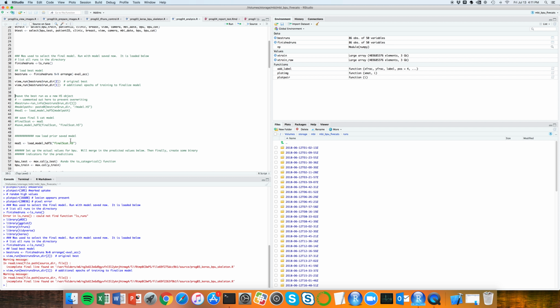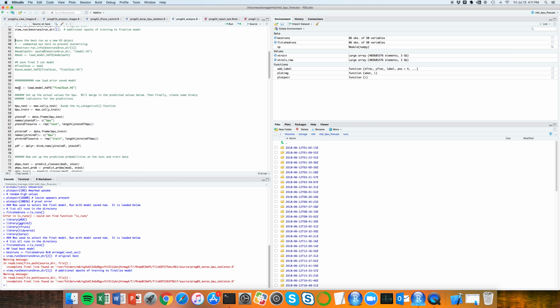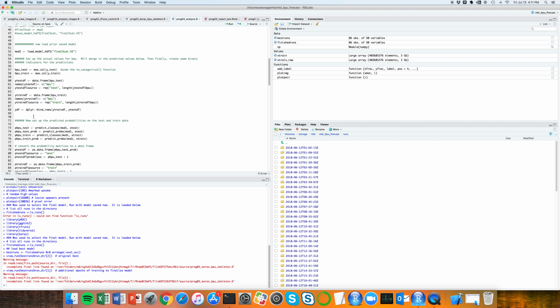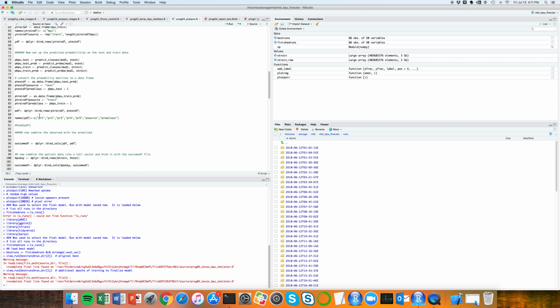Nice thing about using R is it's a familiar language to me, and so I can do very easy things such as save those model objects and then be able to comment those out. You can go through at this point, now that I've saved my final 5-category model, and do some different performance evaluations. So in this case, I'm looking at predicting, deriving some variables.